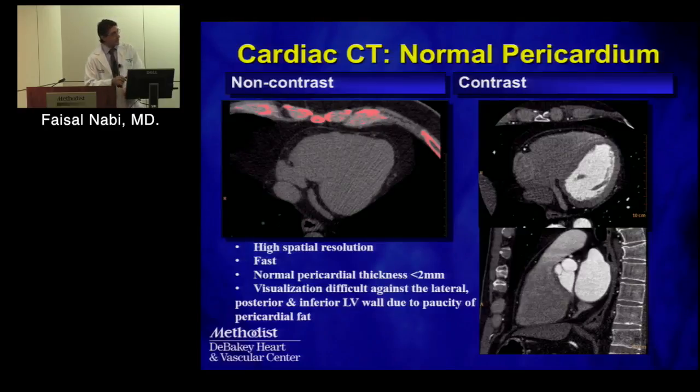Going back a little bit on the pericardium, I should mention that the pericardium is normally a very, very thin structure, just like you're seeing. You probably have difficulty seeing it from back there, but it is less than 2 millimeters on a normal pericardium by CT.